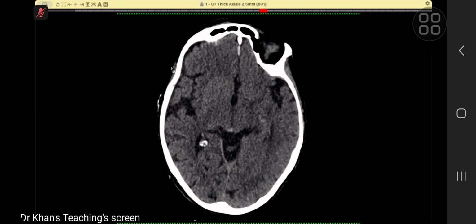So this patient, fall, loss of consciousness, 72 female, rule out intracranial hemorrhage. Over to you. Yes, sir. I'd like to scroll through the images. Yeah, you can ask for the mouse. Yes, sir. I'll just ask for a remote control.